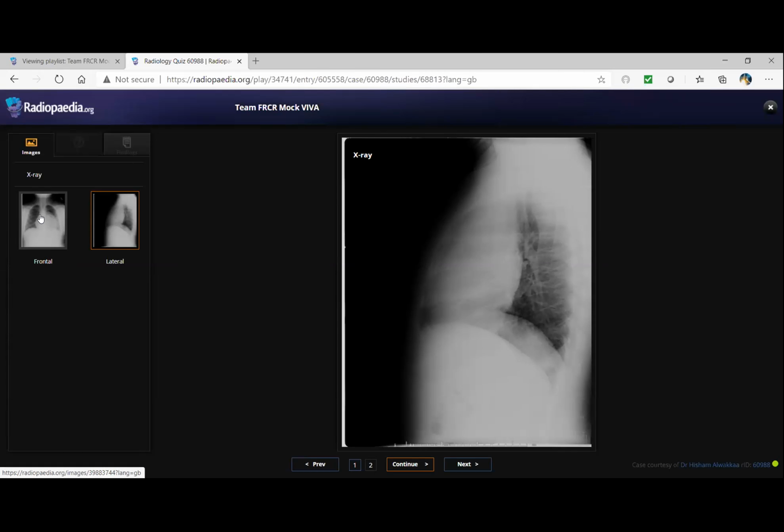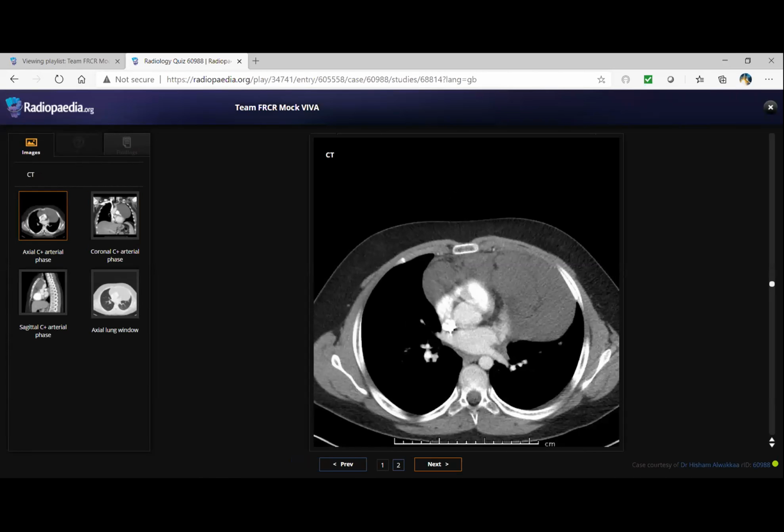The patient is an 11-year-old male presenting with chest pain and shortness of breath. In that case, it can be a teratoma; even though I'm not seeing any calcification, it can be a fat component. So I will compare with any previous images if available, and this patient also needs further evaluation with CT chest and referral to the chest physicians.